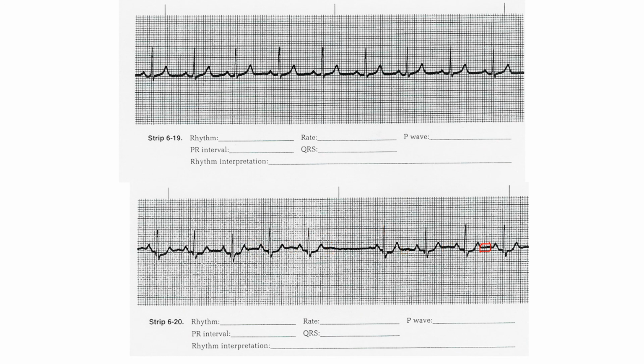So then you have to figure out what kind of pause it is. Is it a sinus arrest or a sinus exit block? Well, if you're doing your R to Rs, these are regular. And as you're doing it, you basically come back right on time. So this is a sinus exit block. It's normal sinus rhythm with a sinus exit block. A U wave is present, and you have a pause of 1.32. So that's how you would interpret that rhythm.